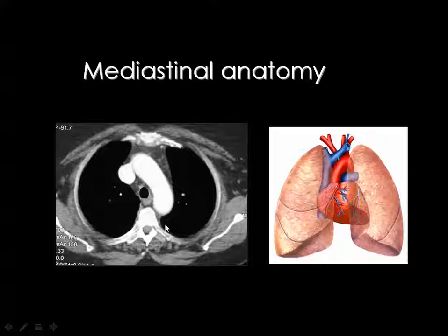Then, starting interpretation of the chest, you should put your finger on the banana, and this is the arch of the aorta. And if you look here, what is beside the arch of the aorta? You'll see the superior vena cava. And here is the superior vena cava and nothing more. This is mediastinal fat, and this is the trachea, and this is the collapsed esophagus, and you don't see any more anatomic details. The arch of the aorta and the superior vena cava.